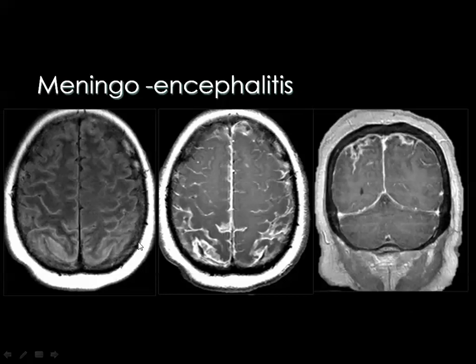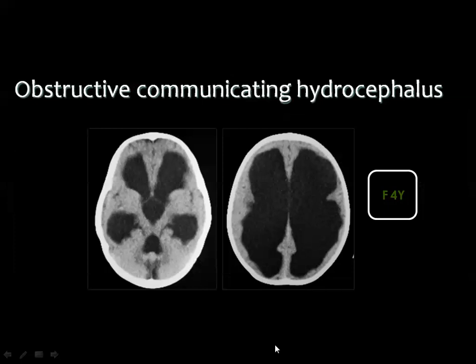And this is a case of meningoencephalitis, where you can see thickened enhancing meninges as well as changes in the brain parenchyma with heterogeneous enhancement, diagnostic of meningoencephalitis.